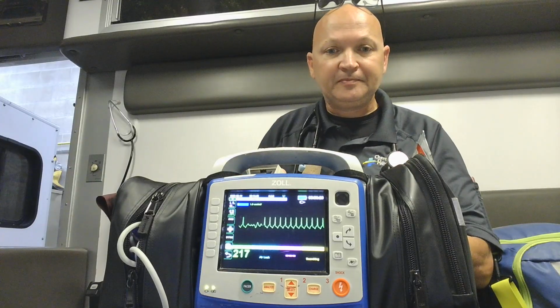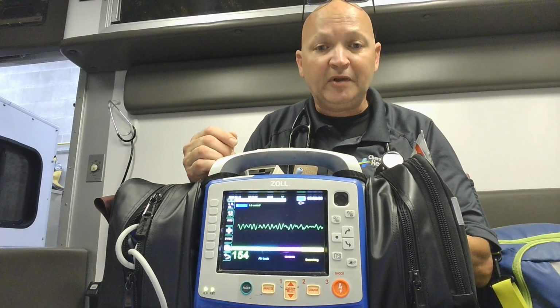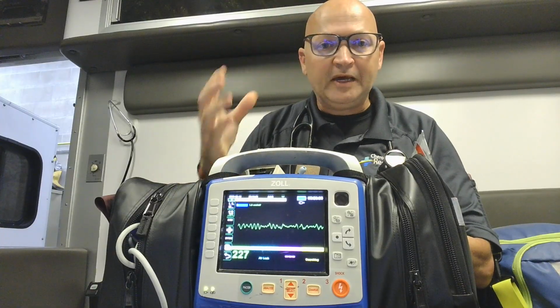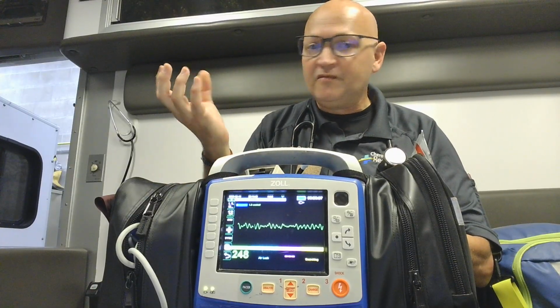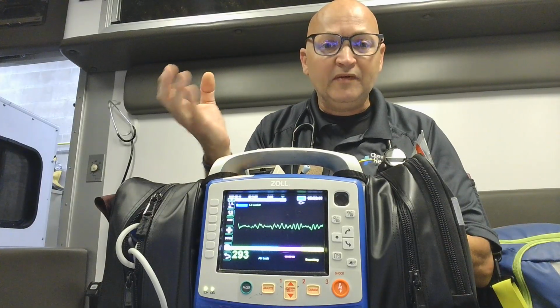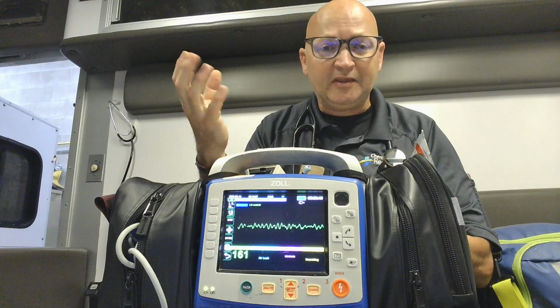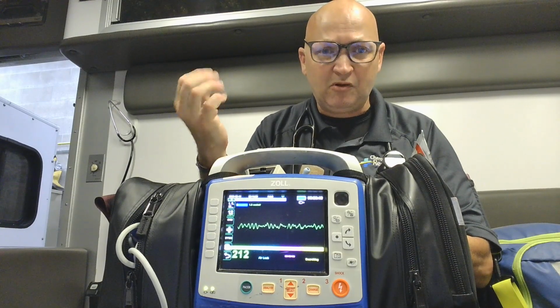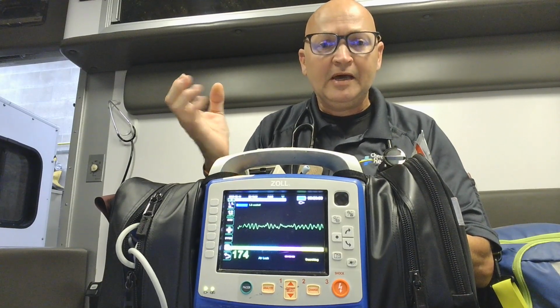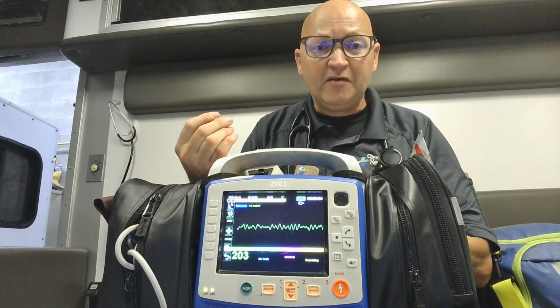So this one, coming up on the screen, is known as ventricular fibrillation. Ventricular fibrillation basically means that the ventricles in the heart are just quivering. They're not actually pumping, so this patient will not produce a pulse, because the heart produces a pulse by pulsing. So there's no pulse with it, and this patient will need emergent care very, very quickly.